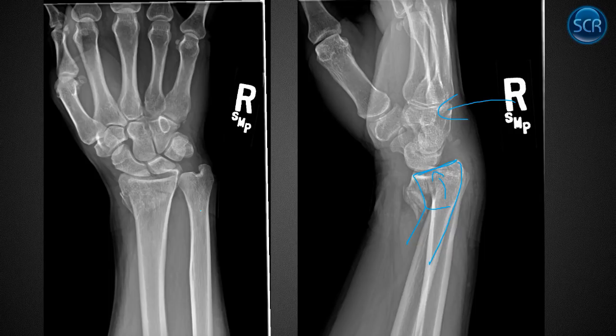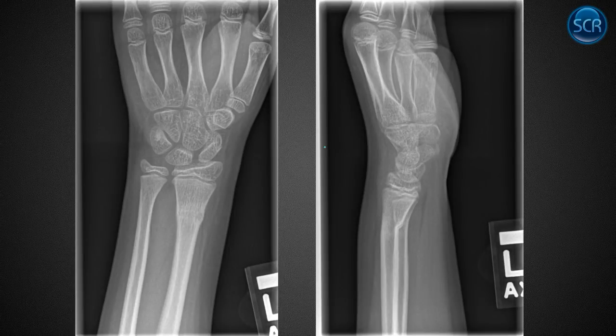And so that's a Smith fracture. So the other one was Colles. This is Smith, just based on angulation. In kids, when they foosh, their bones are malleable, and so they bend and often buckle, and sometimes they'll fracture on one side. So if it buckles and it doesn't have a straight up fracture, that's a torus fracture when it kind of circumferentially goes around. So this is a Smith type with anterior angulation torus fracture.